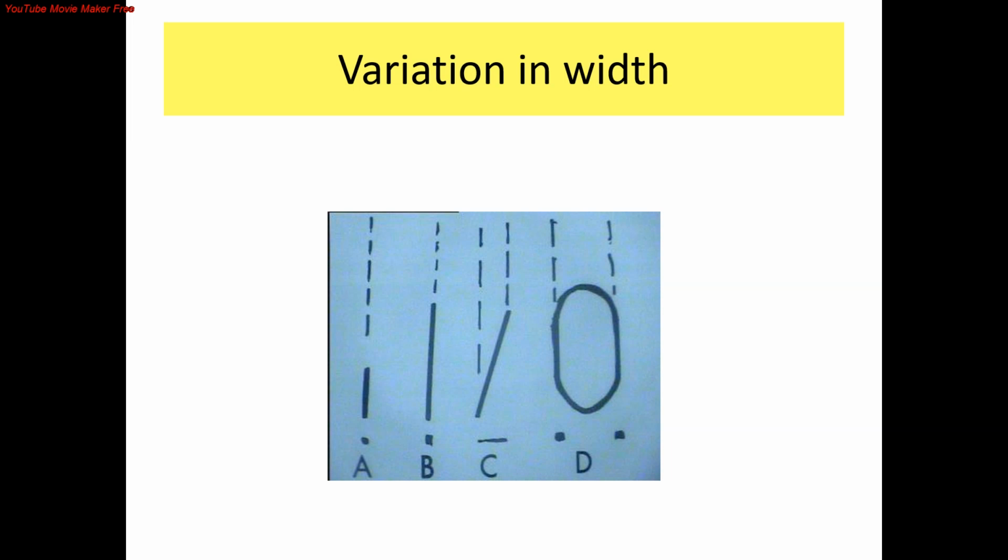dense and radiopaque. In figure C, same length of bone as in B but slightly angulated, so X-rays have to pass through less thickness but more area, so the lamina dura image is wide but less radiopaque. And lastly, in D, a cross-section of the lower incisor socket is shown where mesial and distal margins are equal. So a narrow sharp shadow is seen the same on both sides.